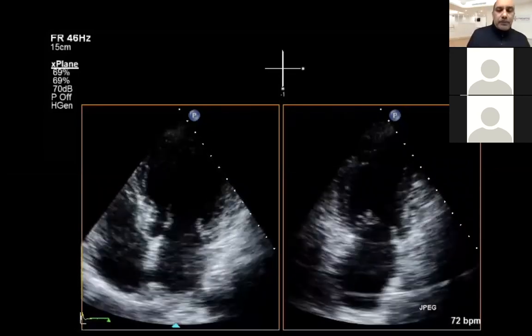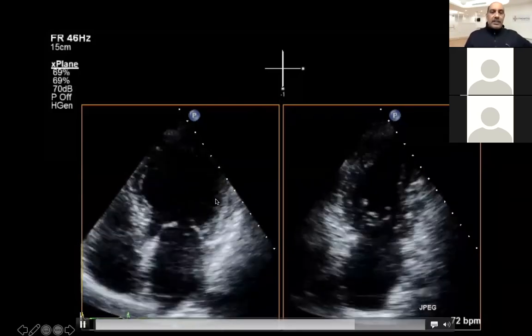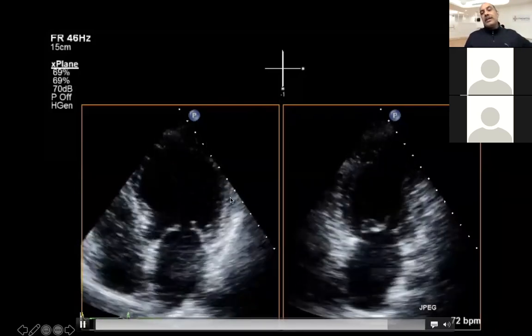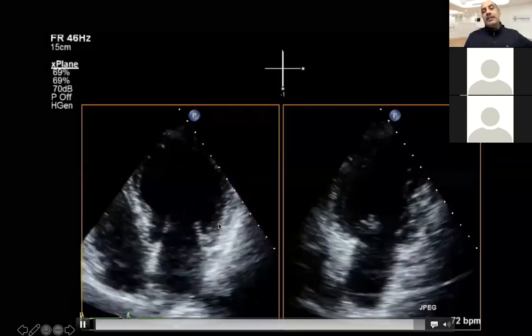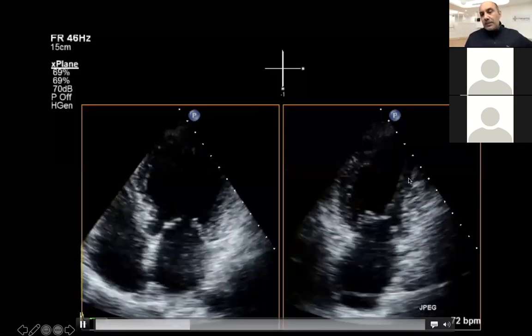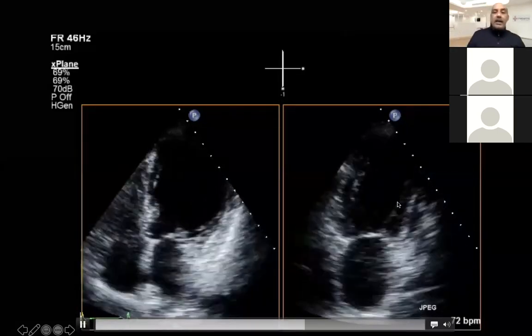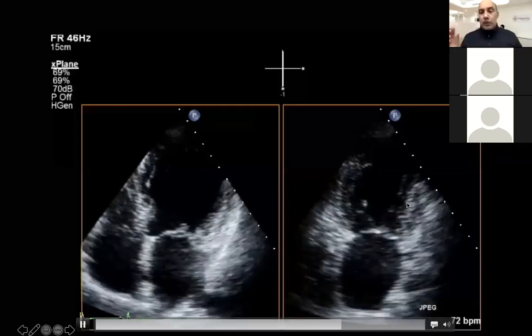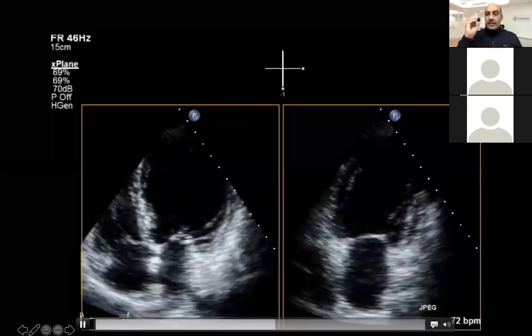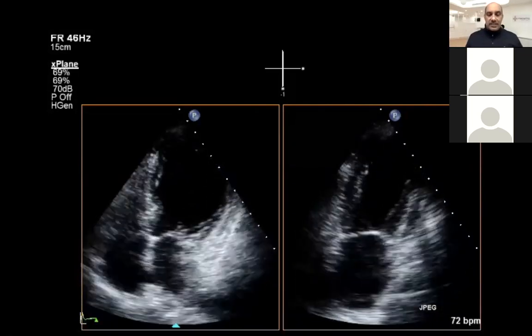So if we cut short the whole scenario, the basal posterior was infarcted, the lateral wall is infarcted. So definitely this is a circumflex territory infarct, which is proximal. And there should also be some involvement of the LAD, which is not infarcted, but it is hypokinetic. So that means a substantial muscle here is alive, however, hypokinetic. So this is a double vessel disease, which I'm talking about.